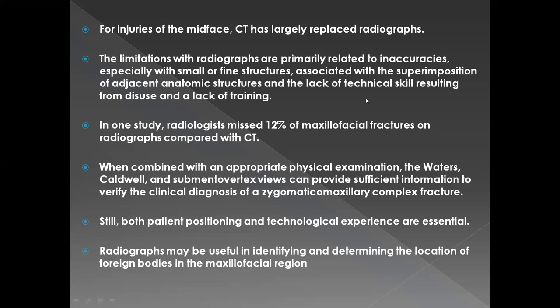And the reason why we don't do CT, but we operate on basis of radiographs, is again mostly patient finances and the lack of a CT scan available in our emergency rooms. In cases where we do have CT, what the radiologists basically do is just a CT scan of the head to evaluate brain trauma, but they don't extend the field of view up to the maxillofacial area. So those areas are then not scanned.